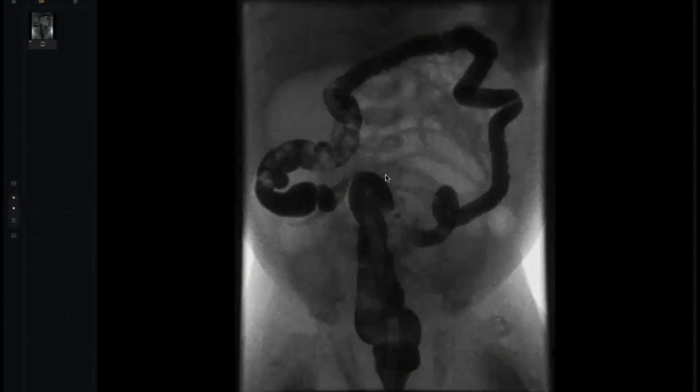Okay, I'm provided with a barium series over here, where I'm able to see the colon. This is looking like the large bowel, outlined with contrast right from distally. I'm able to see the rectum, the sigmoid colon, descending, transverse, ascending colon, right up to the cecum.